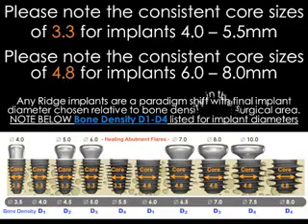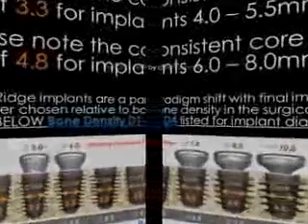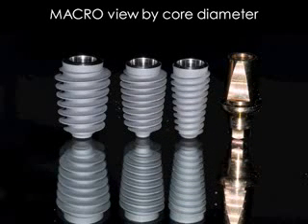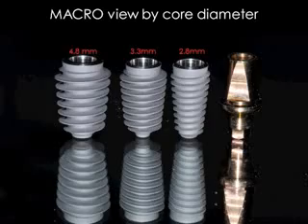Again, D1, D2, D3, and D4. As the density number gets higher, like D4, the thread pattern actually gets wider. So you have D1, D2, D3, and D4 again. But you're really dealing only with 3 core sizes. The 3 core sizes are 2.8, 3.3, and 4.8.